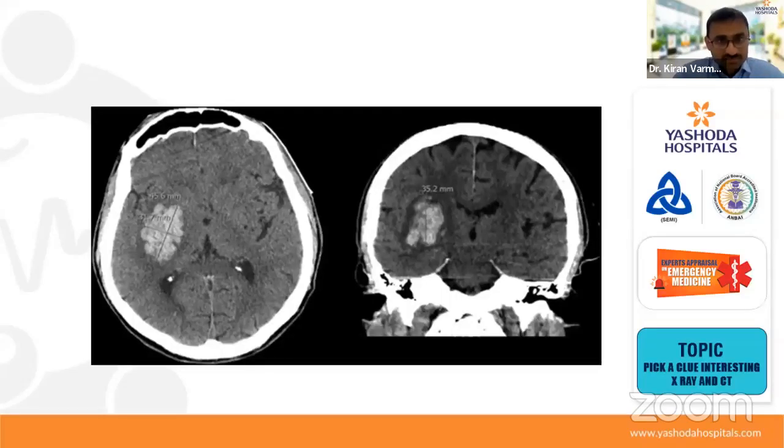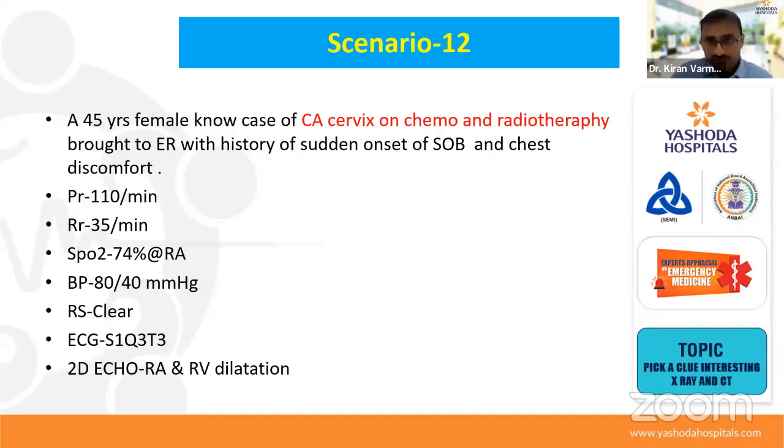So this is how a bleed looks. Think of the same history; CT was done for the same patient. This was the CT. Then what is this? Bleed. CT shows a bleed, typical for hypertensive bleed. So it's hyperdense. The hyperdense area of brain goes in favor of bleed. So this is bleed. Now can you differentiate between these two?